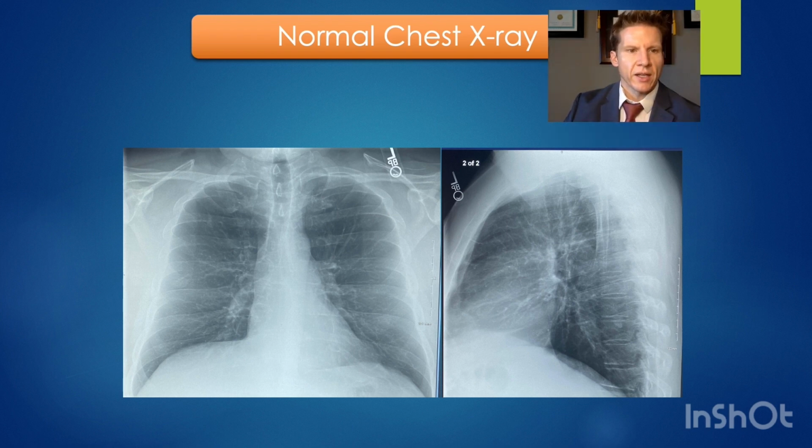Moving on to the trachea and mediastinal structures, the trachea is midline, the heart size is normal. I don't see any abnormal masses in the hilar structure. Keep in mind when we're looking at these structures, we're not only looking for size, but we're assessing things that are either too bright or too dark, whether those are foreign implants, clips, any evidence of surgery, as well as mediastinal adenopathy, other masses, abnormal convexities here at the AP window, and also things that are too dark.